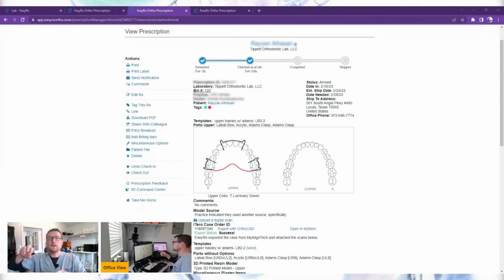And so we can track, and when we need to look up a case, we can tell by the tags where it's at. After I send it to the printer, I'm going to tag it whichever printer I sent it to. So then we know, oh, it's been to the 3D print queue, it's been to the printer. You can also do this with wire bending, the acrylic area, and you can just follow along. And also the doctor can see those tags.